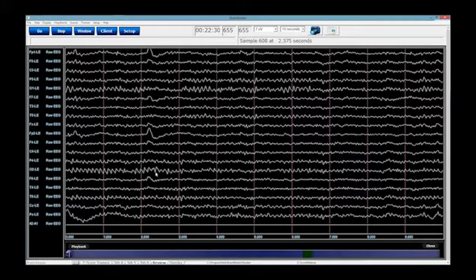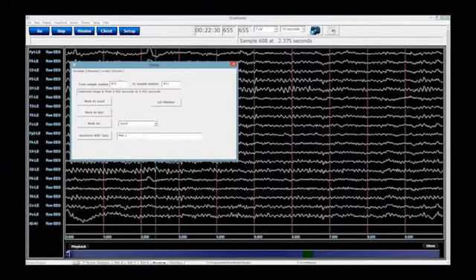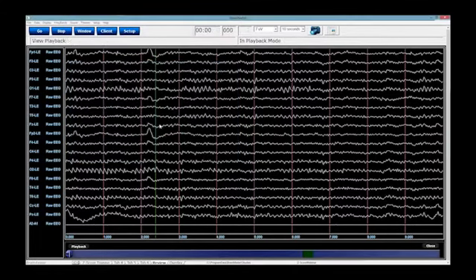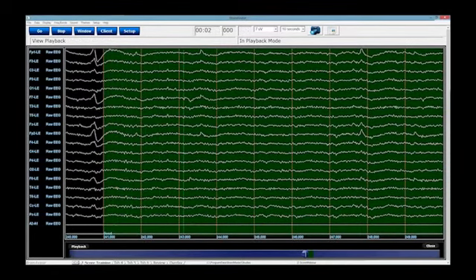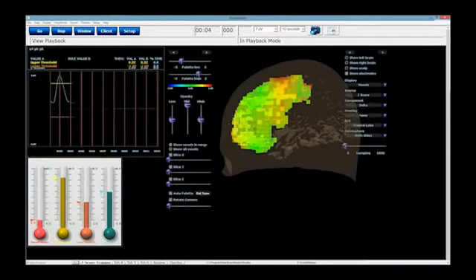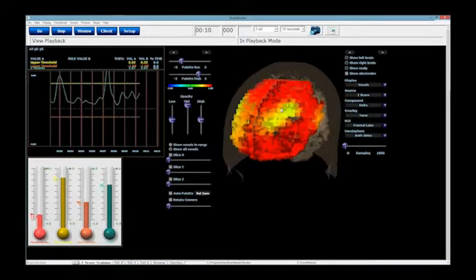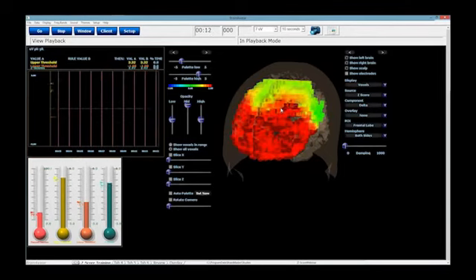Here we go. All right, so now I'm going to play this back with real EEG, and it's going to look a little bit better than that. Sections marked good, play selected EEG, and repeat. Okay, here we go. Now that's looking a little bit more like what we're usually probably used to seeing right here.